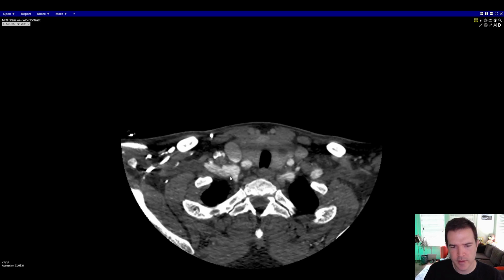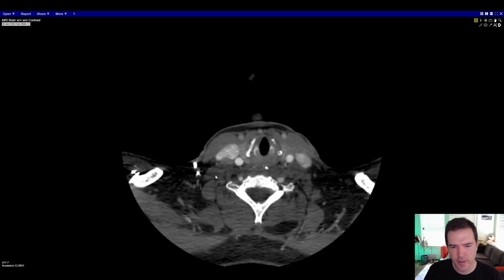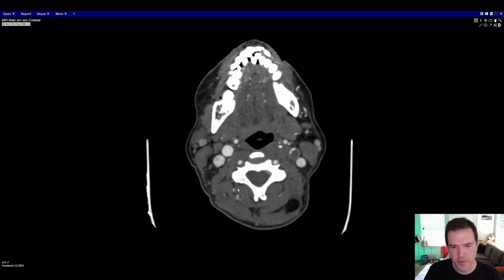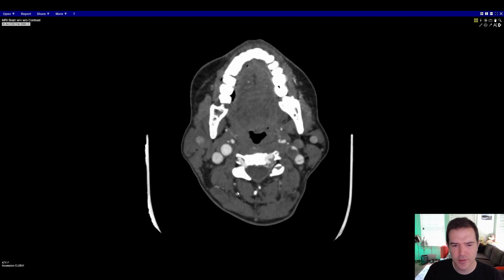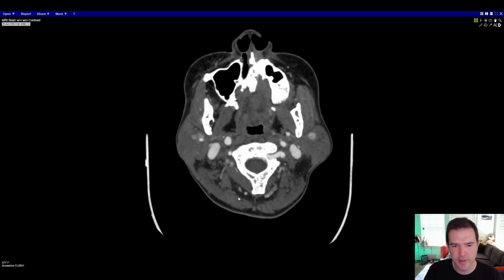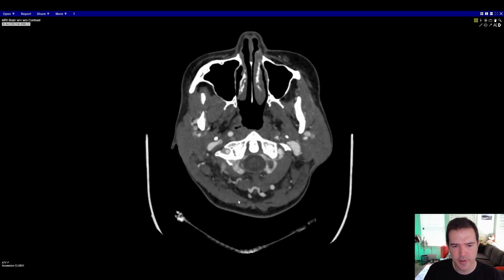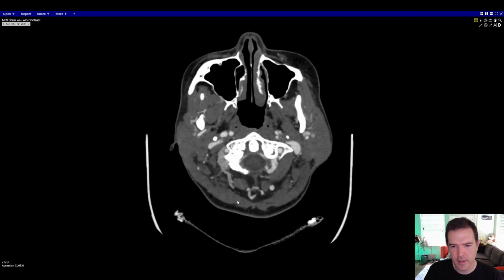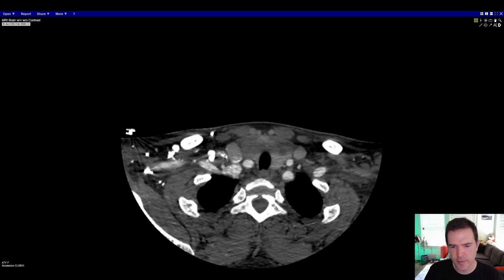We're going to start with this right vertebral artery and just follow it up as it enters the transverse foramen there, comes up. Looks not bad, a little tortuous, but we don't see any real areas of narrowing. A little bit tortuous, it comes up and enters the dura there. And then we'll just follow this other one here from the bottom.